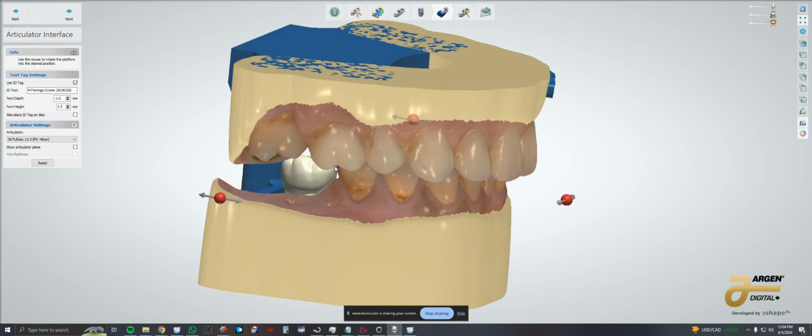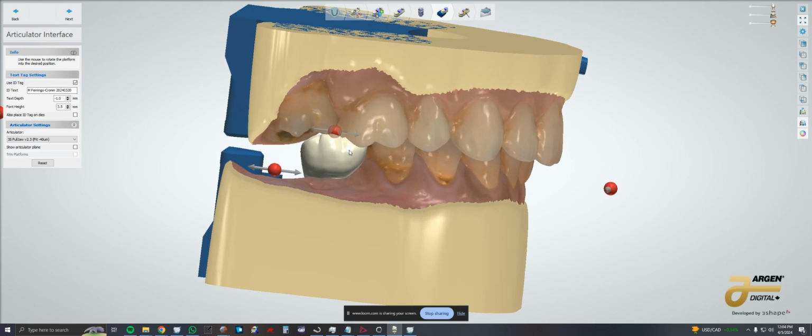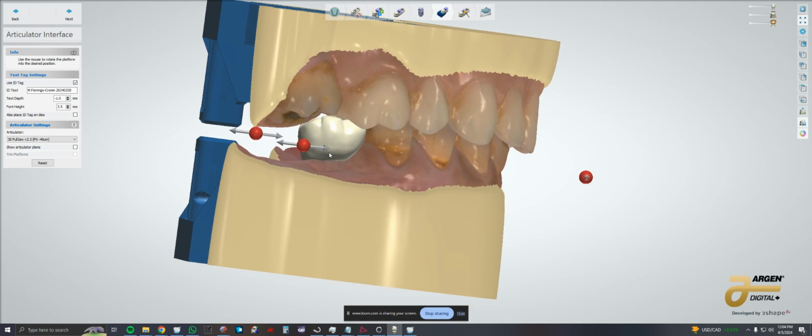So hopefully this helps for you guys if you ever run into this issue with back-ordered analogs, and you can very quickly and easily kit swap out the analog cutout.